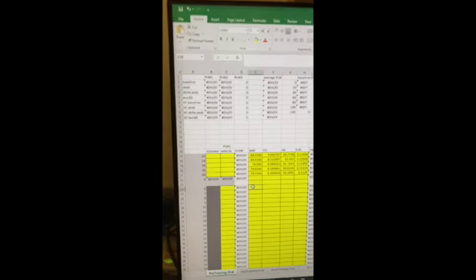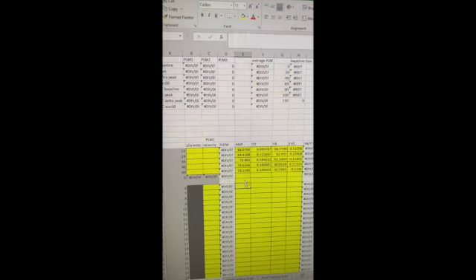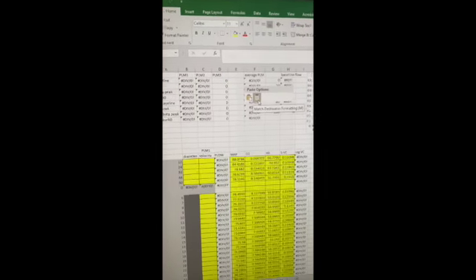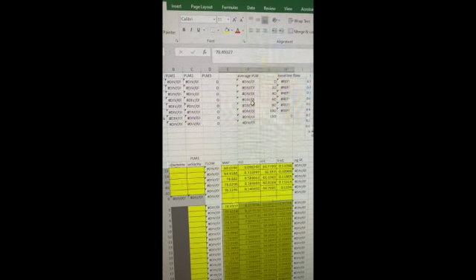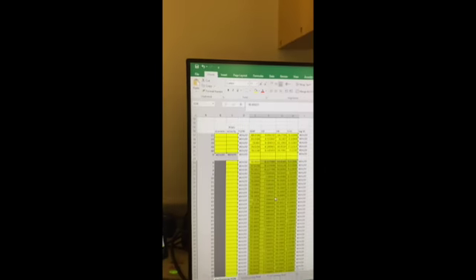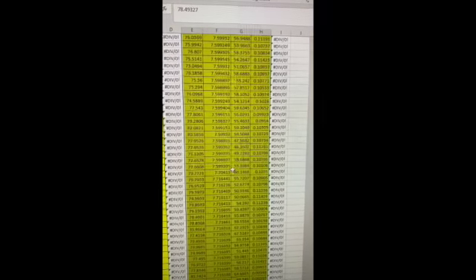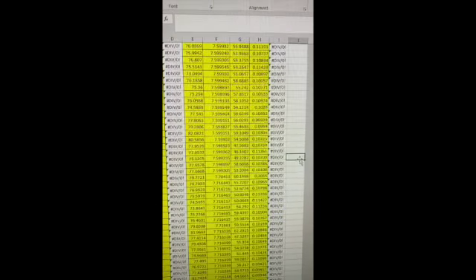So we'll start right here for pasting. We're going to right click here, and then we'll paste those values, and that will give us all of the values that we need for analyzing the PLM movement.